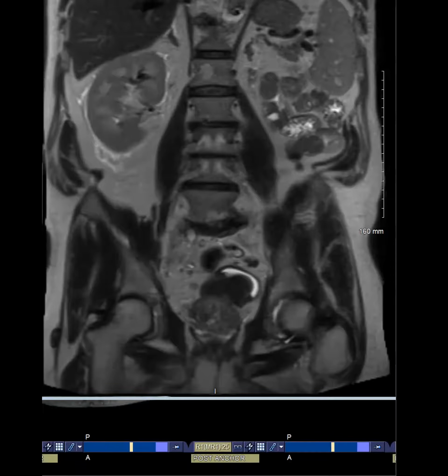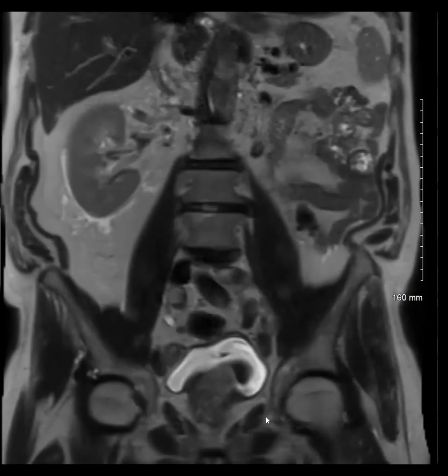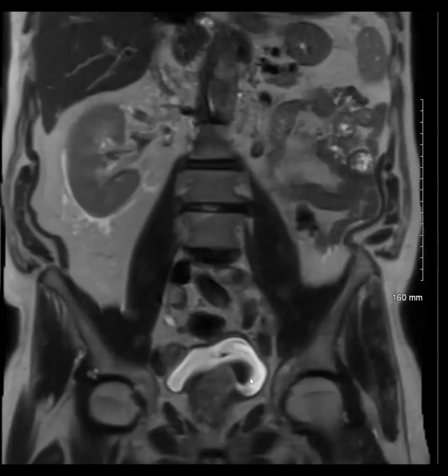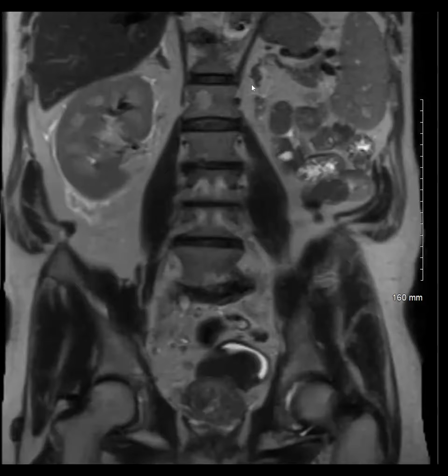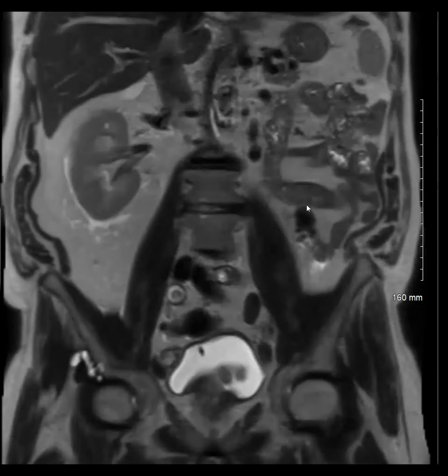Is it like an obstructed ejaculatory duct? You're absolutely on the right track. So if you see an obstructed ejaculatory duct associated with a dilated cystic structure, any thoughts in that direction? And then there's another clue to this syndrome. There's the pancreas. Cystic fibrosis. No. Anything else? Kidney is absent. Left kidney is absent, exactly.